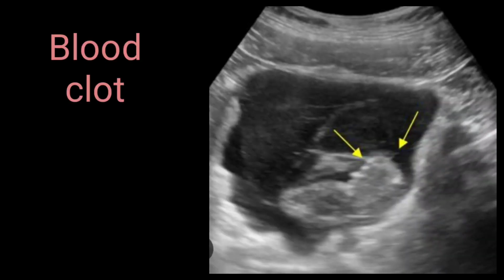This is another example of a blood clot. Although this slide mimics a distended uterus with intrauterine gestation, which is not the case. This is actually a blood clot, indicated by the yellow arrow. On the top of the urinary bladder, here you can see fibrinous layers. It means that there is obvious blood within the urinary bladder.